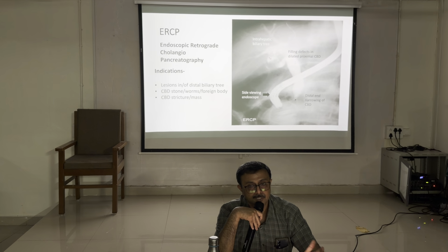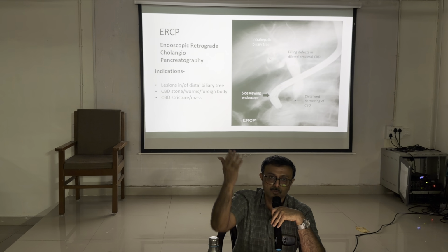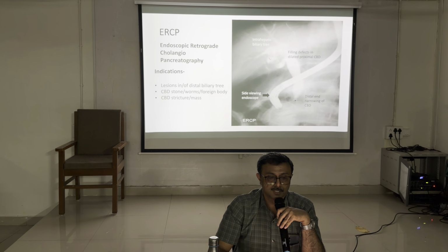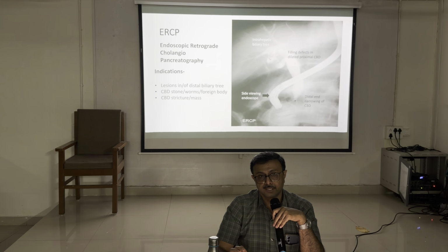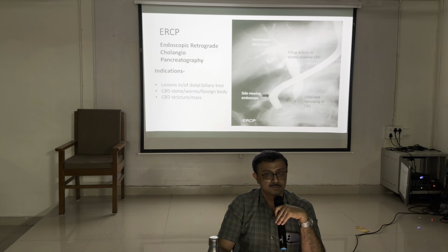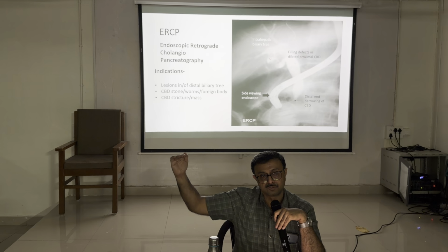ERCP can be associated with EUS, endoscopic ultrasonography. Through the ERCP scope we can do endoscopic ultrasonography. It is the best investigation, along with CT scan, to judge the periampullary area, nearby lymph nodes, and type of lesion. Here you can see a filling defect, dilated CBD, intrahepatic biliary radicles, and a narrow distal CBD, with a side-view endoscope. Sometimes the pancreatic duct is cannulated, and we can see the pancreatic duct also.